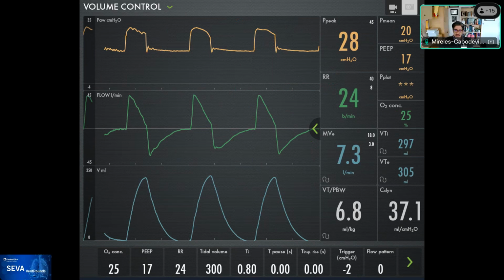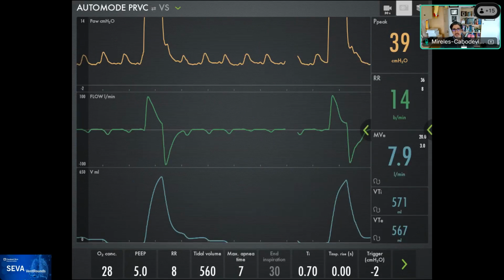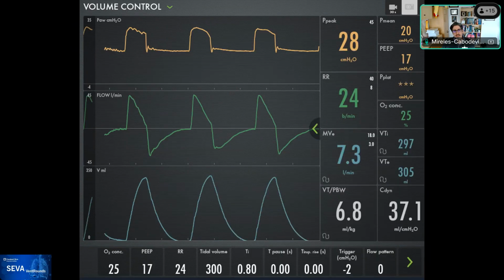Thank you, Sherry. I thought that was very useful. This is not the same patient. This is a different patient, just so that you can see the cardiac oscillations through time. You can see how the frequency is lower, and this is amplified, granted, but you can see how they persist through the cycle. The oscillations here decrease on the airway side because the flow goes down, but there were also other reasons on this patient, which we'll present in another VentRounds.